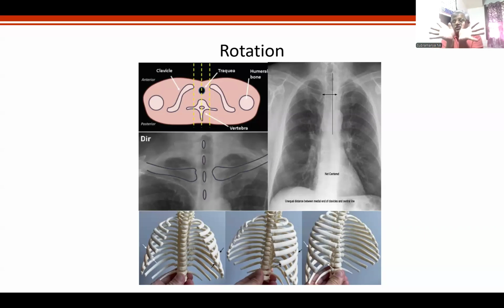See, you see both my hands. Let's say these are the hila of the patient. Now this is rotation to the left. That means the hilum on the right side becomes prominent. With rotation to the right, my right hilum becomes prominent. The left hilum overlaps and becomes end on. The right hilum gets spread over the lung fields. Now I go further.